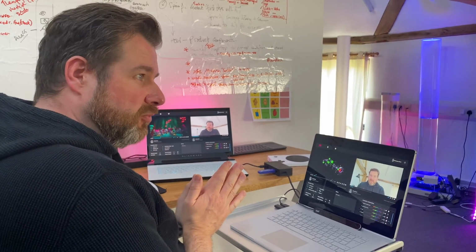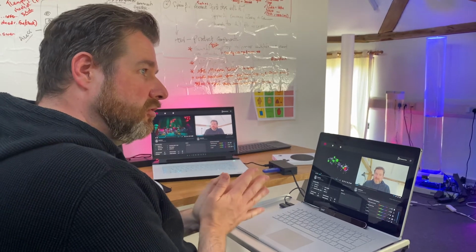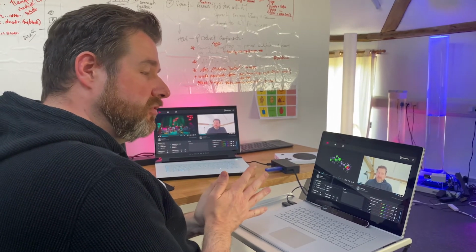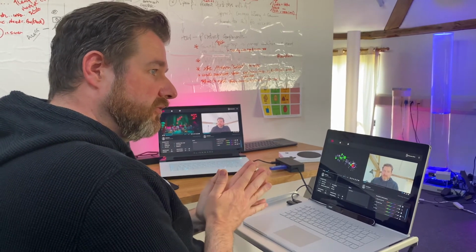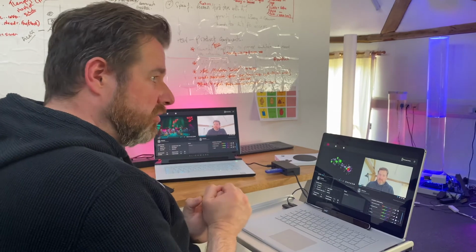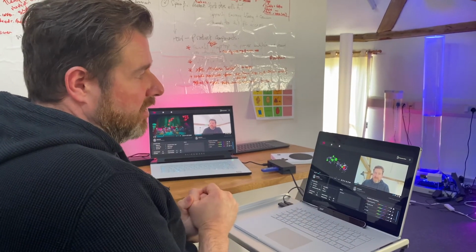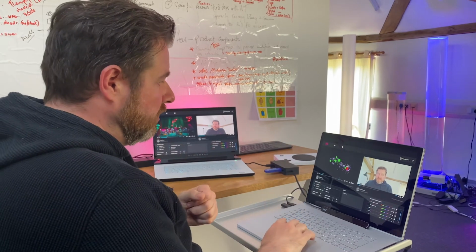So it's not always eye gaze, as we mentioned before. You can utilize this with mouse if you want to. You can utilize this with game controllers. You can utilize this with switches as well. But you will always get the front camera screen on the right hand side to show you how someone's eyes were actually responding to what's going on in the scene.